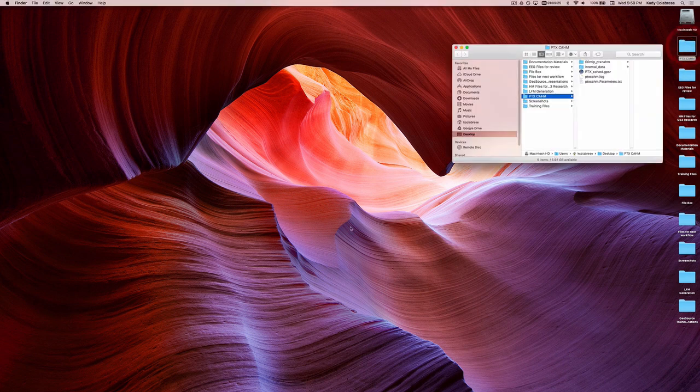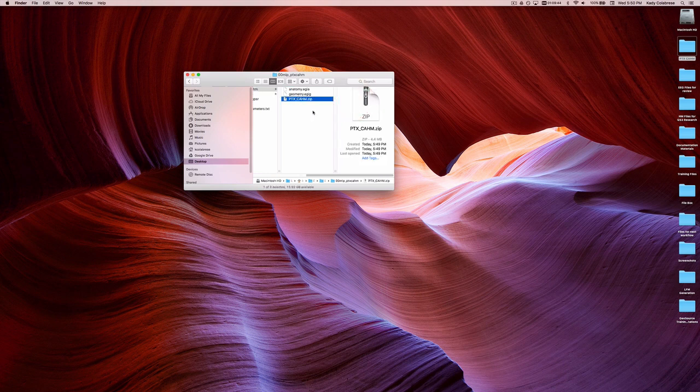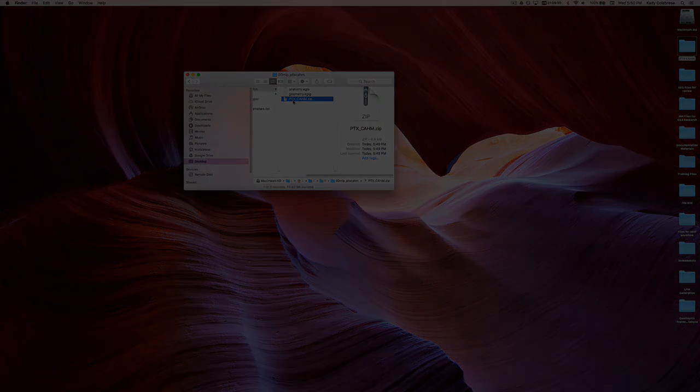Review the files that were created during this process. This is the file name that we entered in the beginning. These 3 files were generated: anatomy, geometry, and this is the job name that we entered at the very end for this file right here. The next step is to create an electric head model.